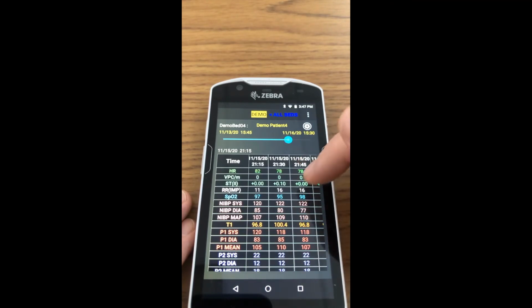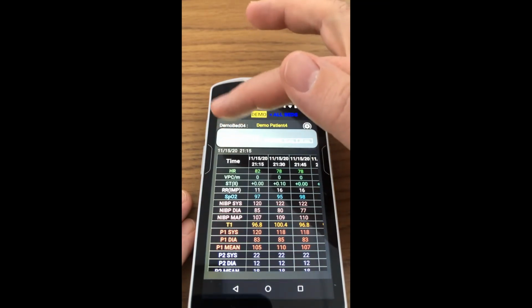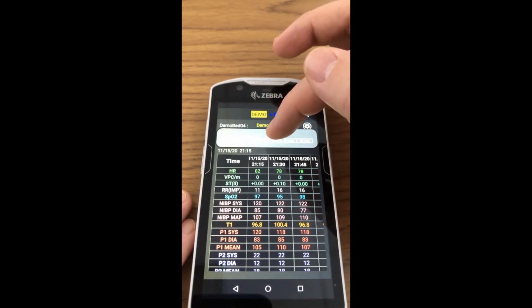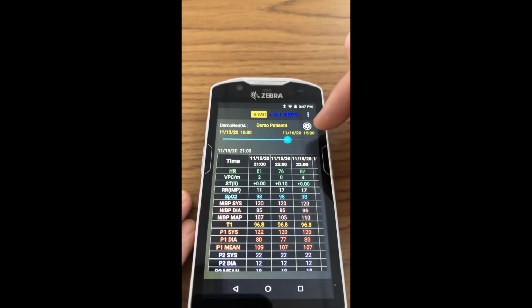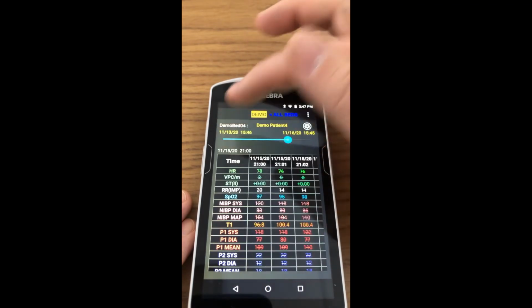If you want to adjust the 1-minute intervals, click the settings icon and select what sampling interval you would like displayed. Currently I'm at 15 minutes. It's hard to make out, but you can go to 30 minutes or 60 minutes or back to the default 1 minute.